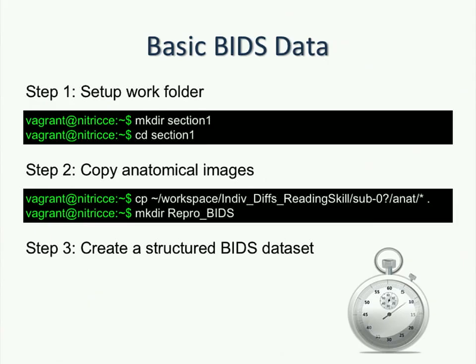The last thing we want to do is move those into a formal directory structure within the reprobids folder. Unfortunately, I can't have two screens open for the data and the specification. This should all work because I tested it last night on the latest version.